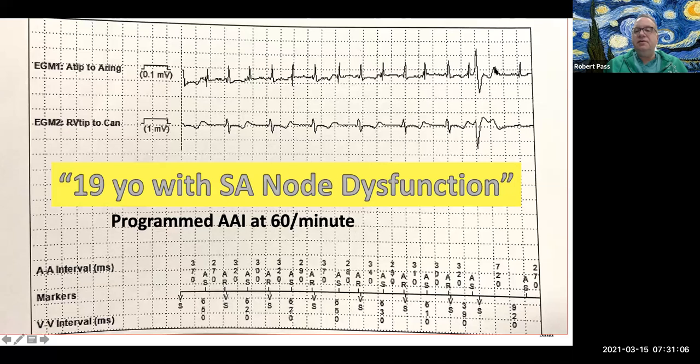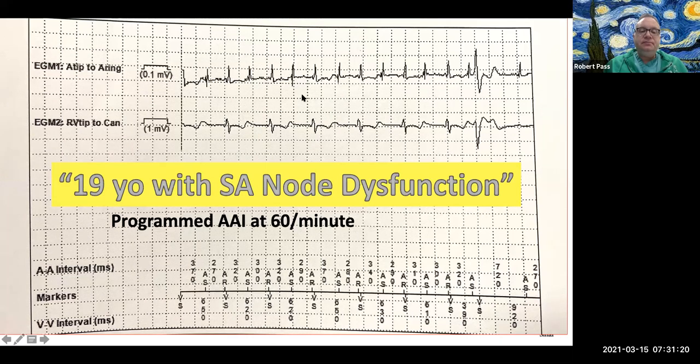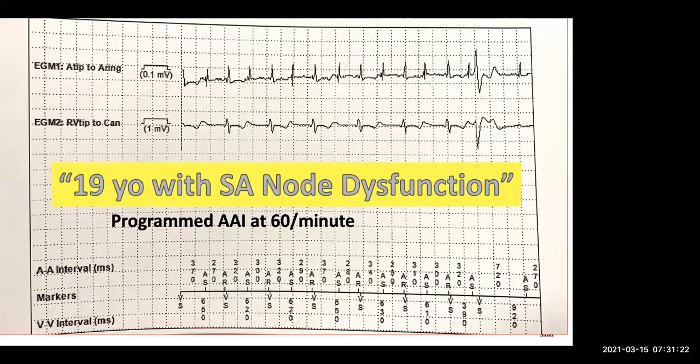So I'm going to ask David Barris, what do you think is going on here? I'm seeing that you're saying the top one is the atrial rate, and that seems to be quite a bit faster than the ventricular rate. Yeah. The atrial rate looks to be even faster than 150. It's almost like 160 beats per minute.